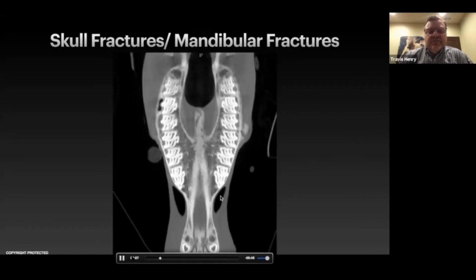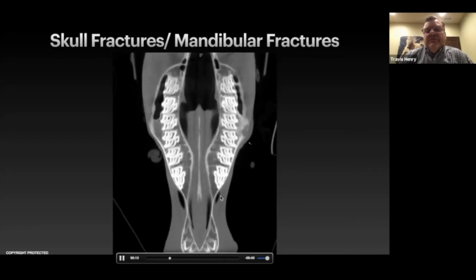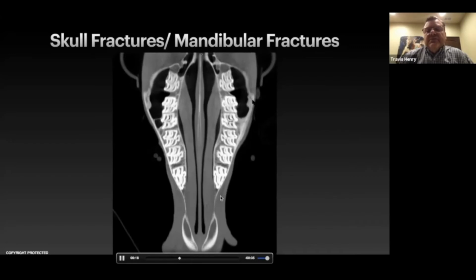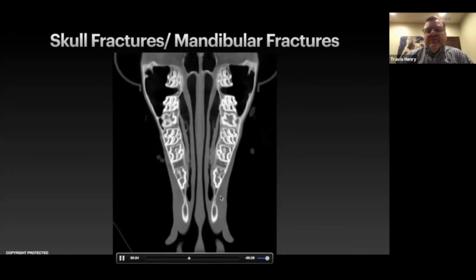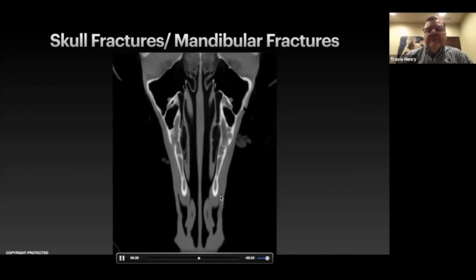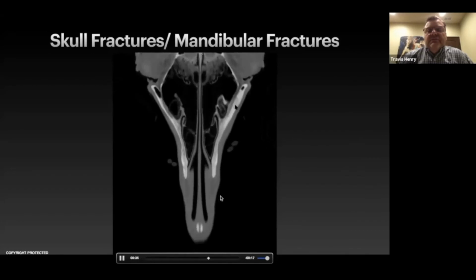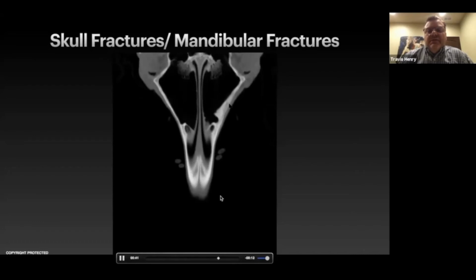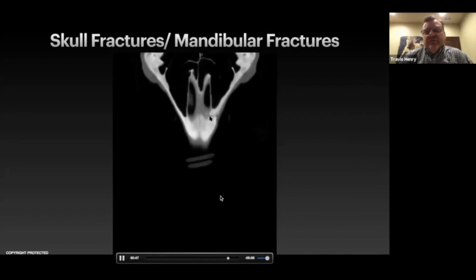facial crest. So when we stop right here, we can see that there's a sequestra laying right there. And then as we follow this horse up farther, you can see these lines running here, an enlargement along the maxillary bone as we head up towards the frontal region, and we can still follow a discrepancy in this region. And actually you can see it again here. And as we go even farther, we're still seeing it all the way up to, we're actually coming back forward then and right across toward the central midline of the horse's head here.